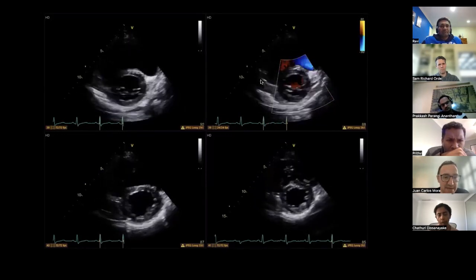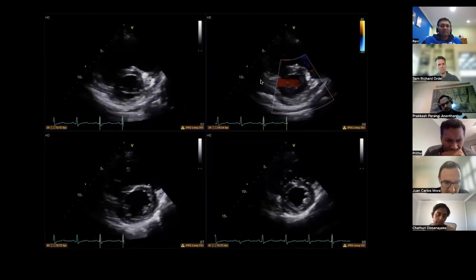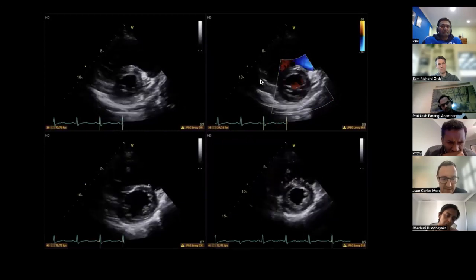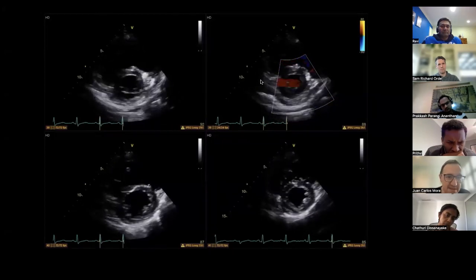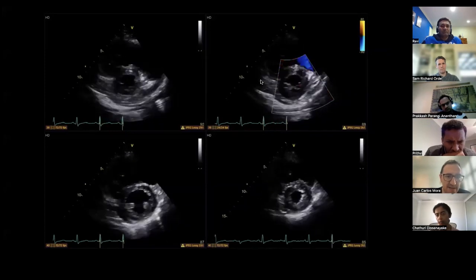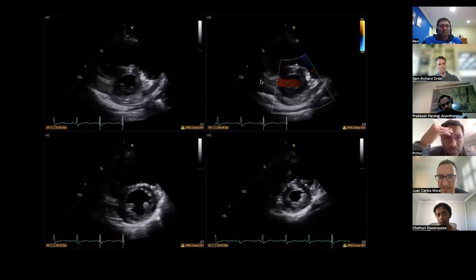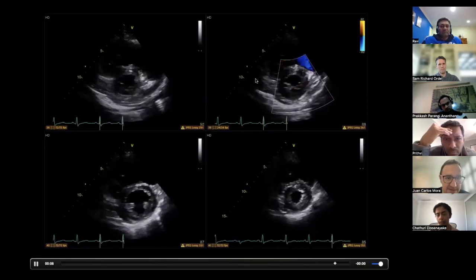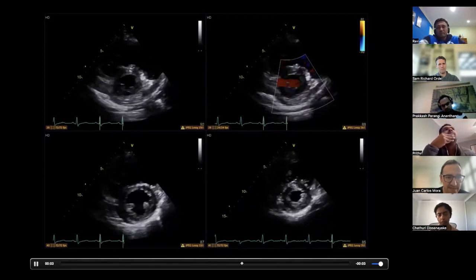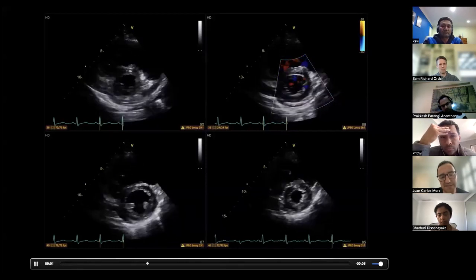So we've got parasternal short axis views, and the LV appears to be contracting well. The significant abnormality for me is that the RV looks very dilated and globular, and although this is not a classical view to assess RV size, it makes me worry. However, there are no other secondary features of pulmonary hypertension, like interventricular septum shift towards the left.